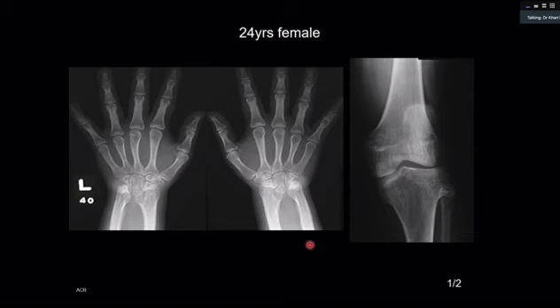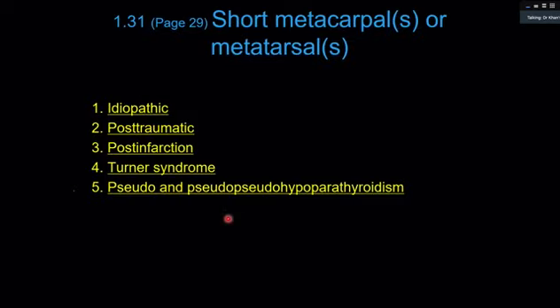And in Turner syndrome, I've just given you, for the sake of making it a unifying diagnosis, at times the medial epiphysis of the tibia is also flattened like this. But this finding, don't expect it in the exam. This is enough for the exam, because a short fourth metacarpal per se is an exam differential diagnosis, and it has come in the exam.